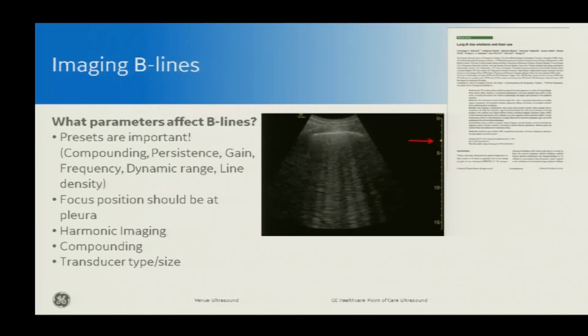What about a linear array probe? Why do some physicians want to use a linear array? Most of the time when they use a linear array probe, it's because they're really focusing on the pleura itself. The pleura is more superficial. In some cases, especially in critical care, they're very interested in small subpleural or juxtapleural consolidations and surface irregularities, like in lung fibrosis or in patients with ARDS.